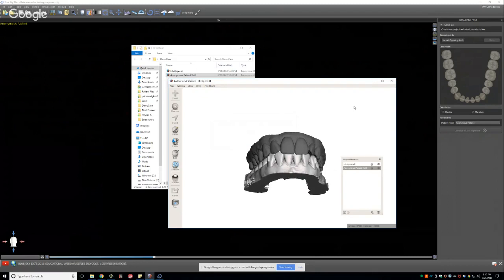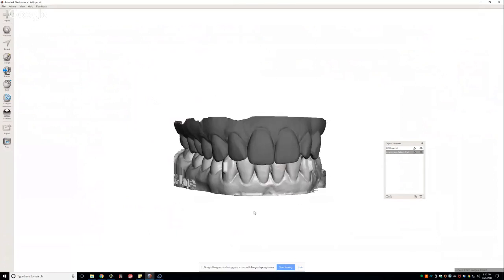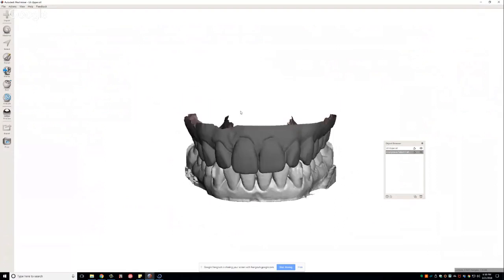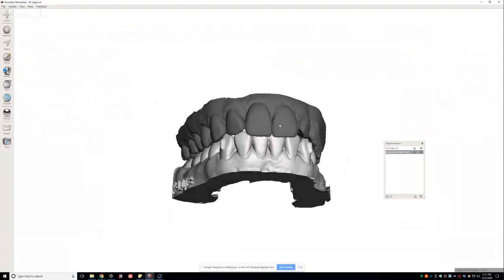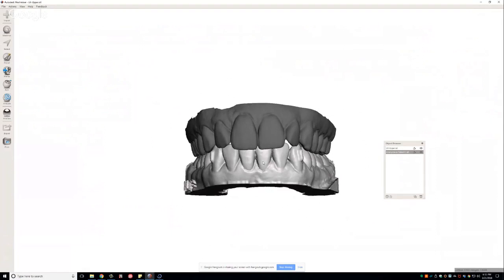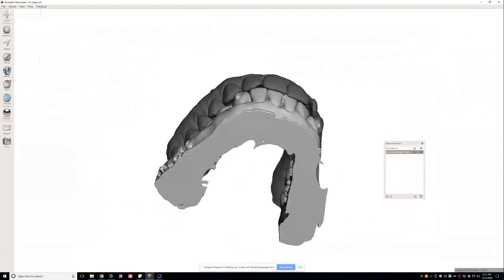The other reason is that the series of videos I recently put on YouTube, which walk you through the software one step, one phase at a time, are also on this case. So I thought it made sense to stick with the same case, since people are familiar with it and can translate it to work at home. The models for this case are also available on Blue Sky Bio's website, so if you're watching this later, you can quite literally follow along and do the things I'm doing, if that's the way you learn. But yeah, this is the case that we're doing now.